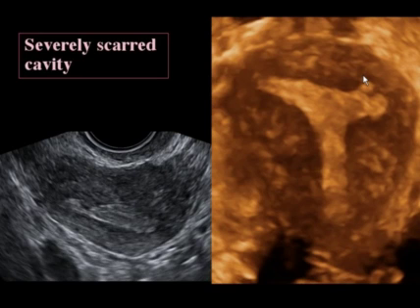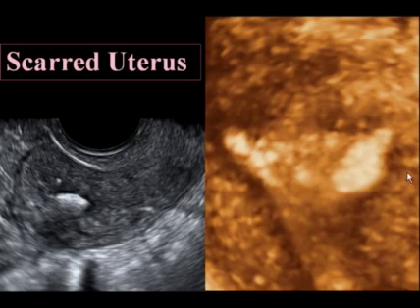Here is a uterus that is severely scarred. You can see on the 2D that there's an indentation here, and on the 3D you can see the scarring in the cornu here, probably from multiple D&Cs and perhaps prior pregnancies. Here is also another uterus with a calcification, and in 2D you can't really tell where this calcification is, but in 3D, when we can depict the uterine cavity, you can see the calcifications are in the endometrial region, in the region of the cornu.